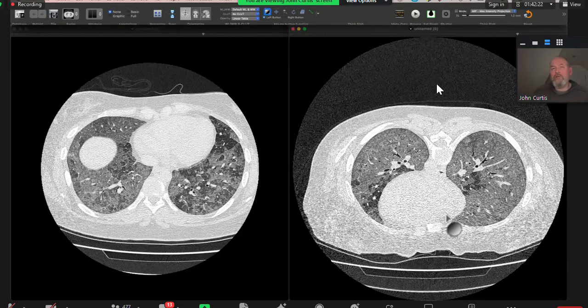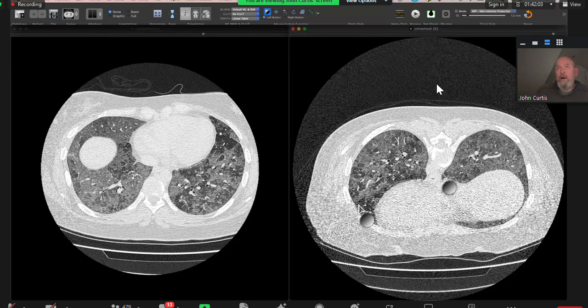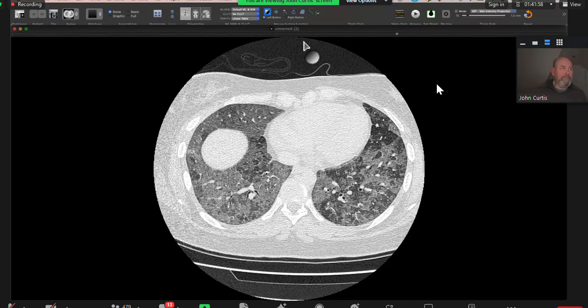This isn't an expiratory scan, but when you turn the patient prone, you effectively get an expiratory-like scan on the dependent portions because the weight of the patient makes everything expiratory. It's not the greatest example, but when we did the expiratory views, all of these areas were accentuated. So the difference in density between the two were accentuated.